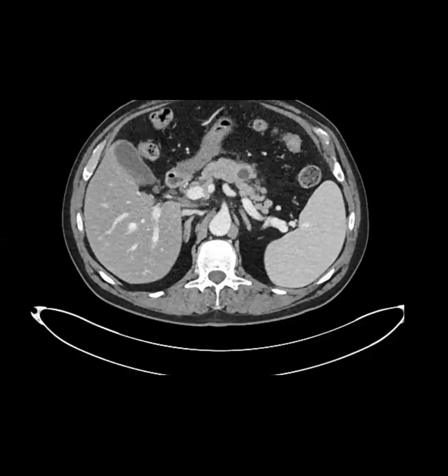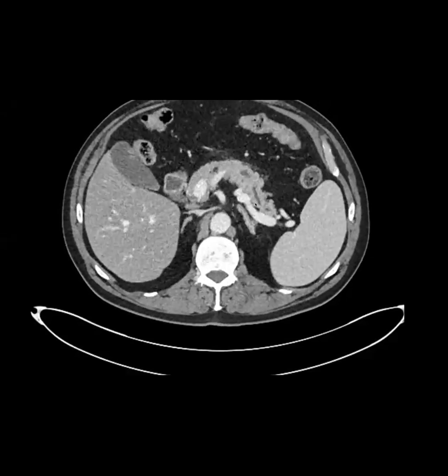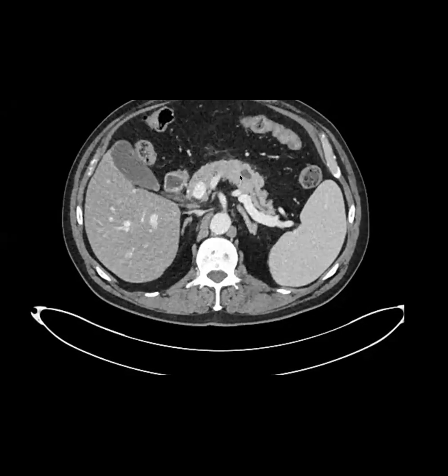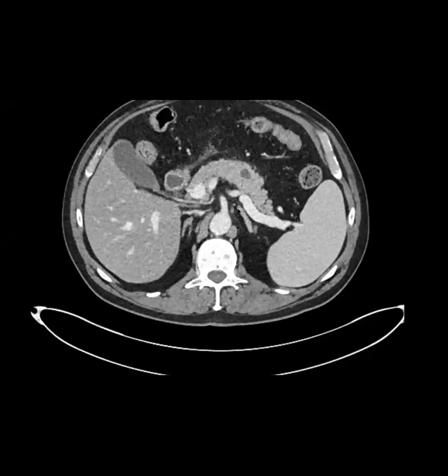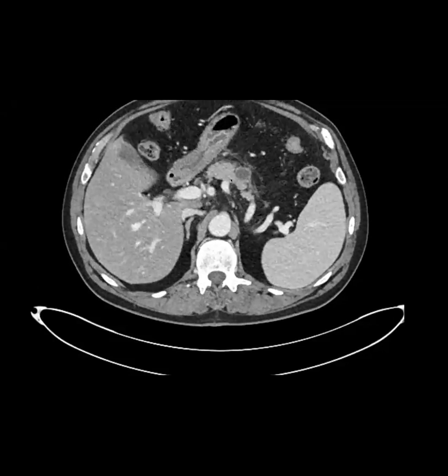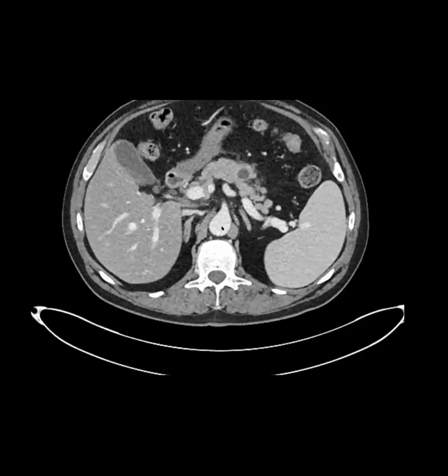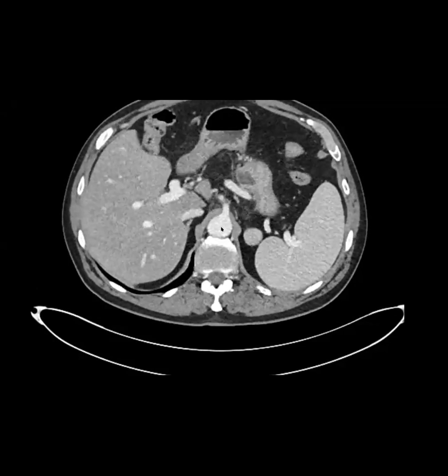The patient did end up going for a pancreatic ERCP, and it showed extravasation from this duct. So they placed a pancreatic duct stent, which is basically the treatment for a disrupted duct. This patient also has a history of acute recurrent pancreatitis, about 20 episodes. We were also talking about how we're not really seeing a lot of findings of chronic pancreatitis here. We don't see calcifications, but there is a denser, more fibrotic part in the body here. So this was an unusual case where we don't see all those changes of chronic pancreatitis.